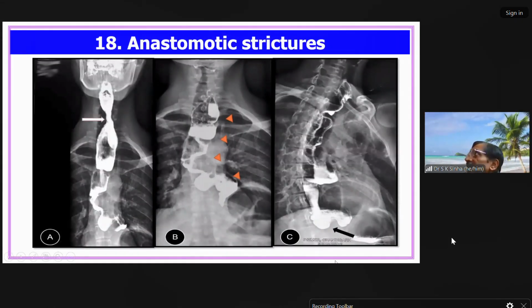So a little bit we will cover other types of radiology. This is conventional radiology, which is barium study. Barium study is very sparingly used now, but one situation where it is still useful is in the situation of leaks and esophageal strictures. So for esophageal strictures, it is always preferable to do it.